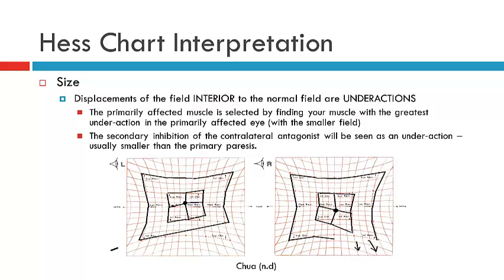So it's not uncommon to not see the complete muscle sequelae. This indeed might be indicating that for this patient, this is a recently acquired neurogenic palsy rather than a long-standing palsy. We'll talk more about differentiating between long-standing palsies and recently acquired palsies at a later stage.